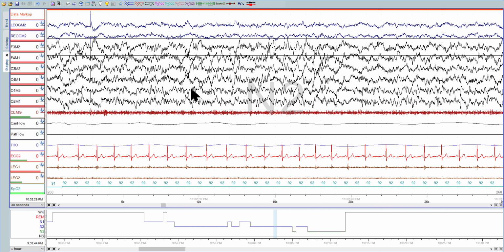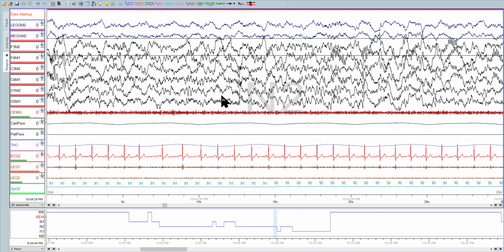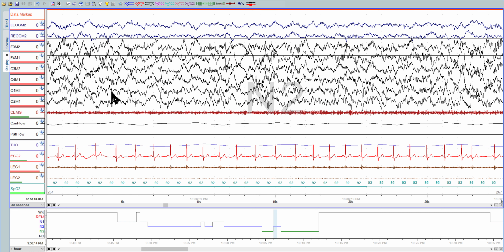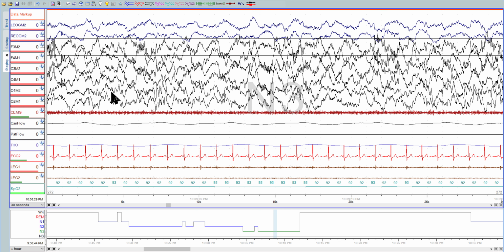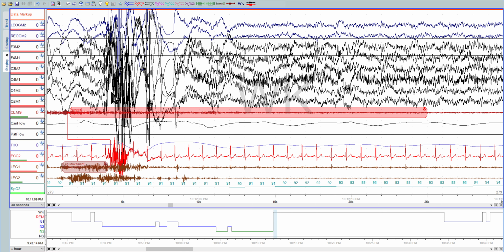Very consistent here. And this one I think is 3, 3, 3, and arousal, good, to 1, to, nope, to 3 still actually. Have enough brain waves here for 3. And then 2, and then back to 3, 3, 3. So really good stuff so far. Wake.